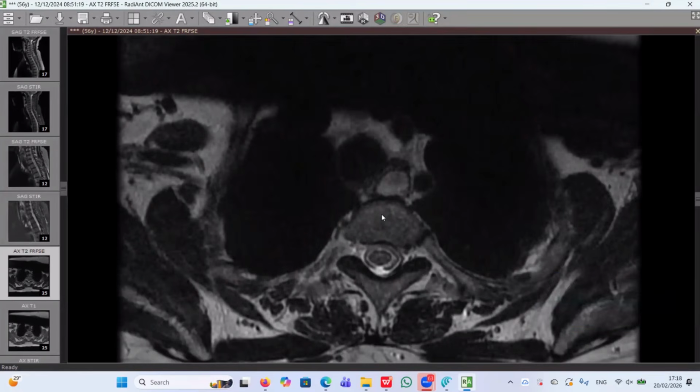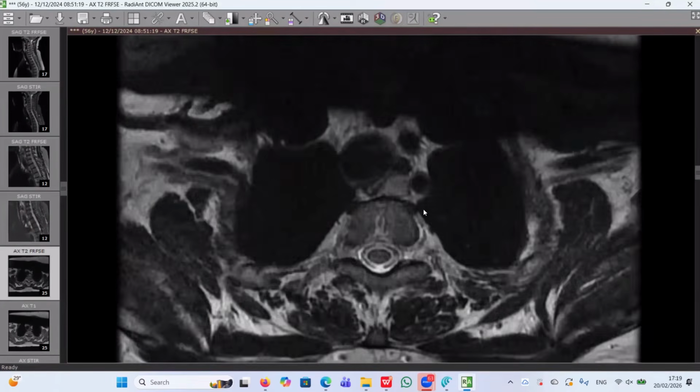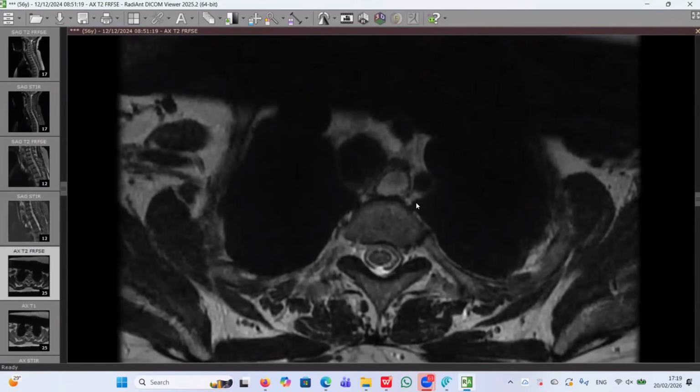Can be arising from the sympathetic chain. Can be arising from the parasympathetic chain, paraganglioma, or something like this. So we have neurogenic tumor, most common. If we are thinking about the differential diagnosis for posterior mediastinal masses, it's very easy. Don't memorize. Please think of the anatomical structures, and you can pick up the differential diagnosis. You can say esophagus, esophageal tumor, esophageal duplication cyst. It's not a cyst. Maybe aneurysm coming from the aortic arch. It's not an aneurysm. Maybe the nerves passing here.